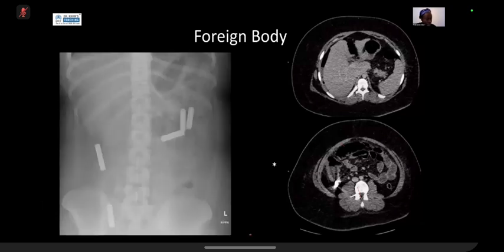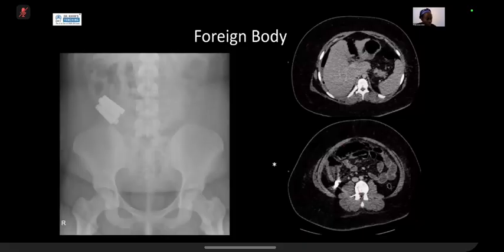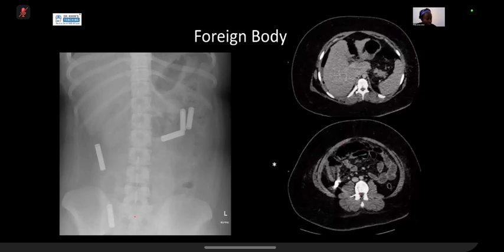And then on her subsequent radiograph, things had moved on. We actually found out there were actually 5, because the 4 were obscuring the 5th battery. One had progressed into the ascending colon and 3 were in the transverse colon, but one stayed within that right iliac fossa and looked like it was more inferior than it had been on the prior radiograph. If I just flick back for you.